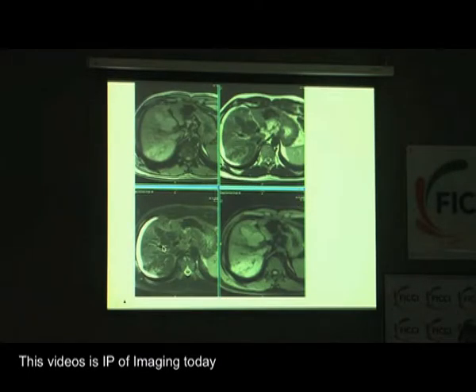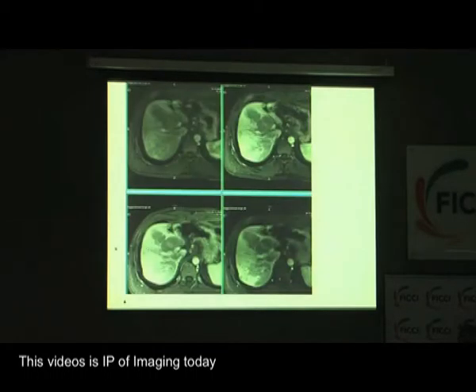On MR, this same patient shows low signal in the areas of fibrosis on T1 weighted scans. There is hyperintensity on T2 weighted images because there is an inflammatory edematous component, and this is of course accentuated on the fat-sat images, and you can clearly see the capsular retraction as a step, but the contour of the liver is smooth. When we use contrast, there is progressive enhancement, again because fibrosis tends to retain contrast.